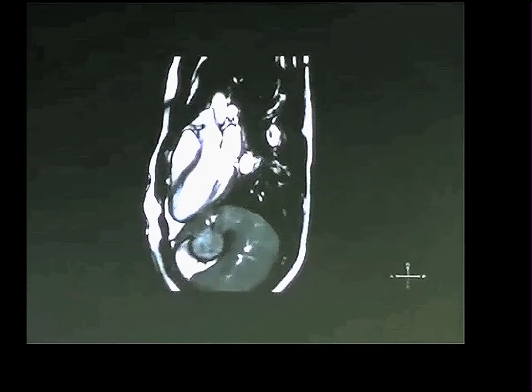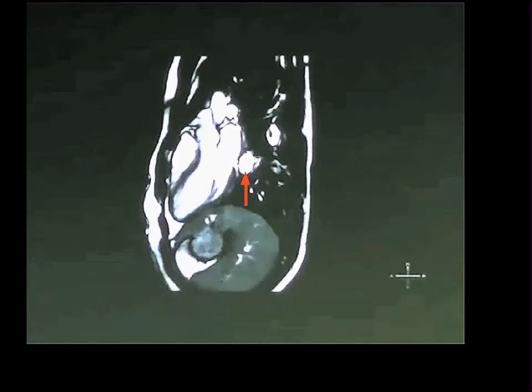So you can see the left atrium emptying into the left ventricle. You see blood coming out of the aortic vestibule and through the aortic valve into the ascending aorta. You see the right pulmonary artery. It's probably the left pulmonary artery. I don't know what that is. And so that's right down the middle, a mid-sagittal section.